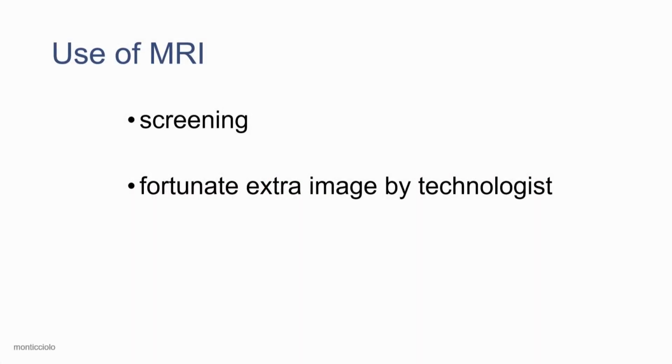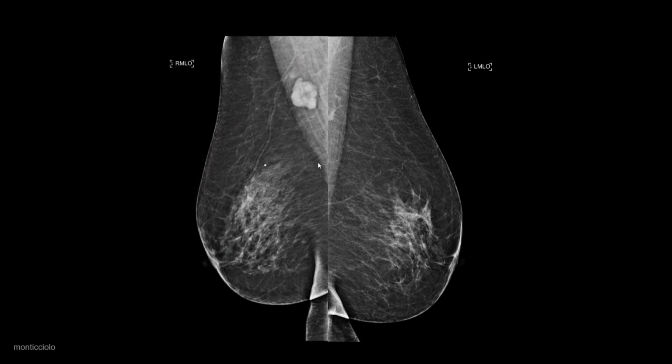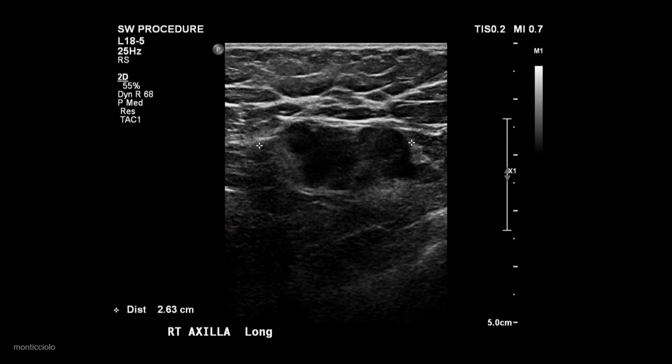And one more case, this was a good example of how important the technologists are and what we do as breast imagers. So this patient was very stiff and had difficulty moving her arms, so the tech was having a hard time getting pectoralis muscle in. You can see she's just barely heterogeneously dense. She got fairly good pec on this side, not optimal, but on the right she really just couldn't get it. So she really pulled her in, and this is what popped out. So she's got an enlarged axillary node on that side. The rest of the breast, though, looked pretty normal.